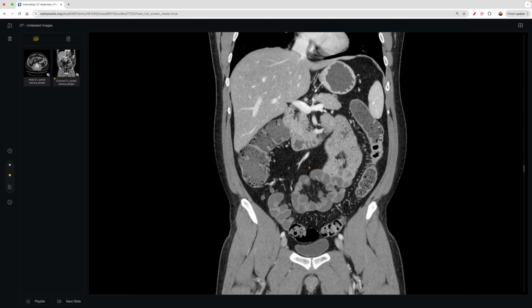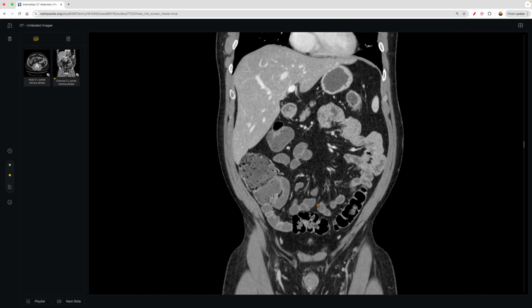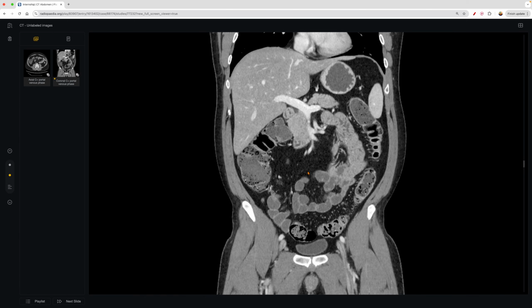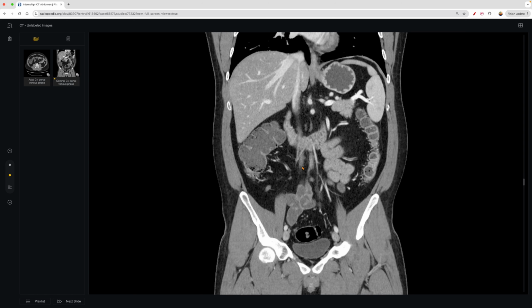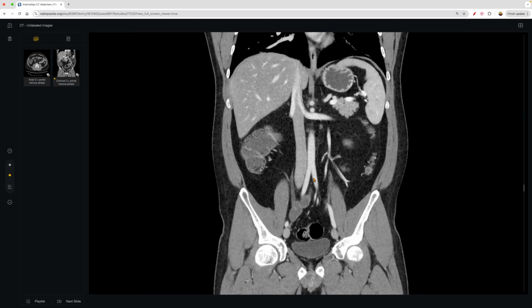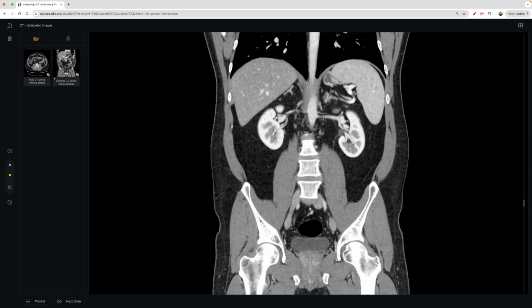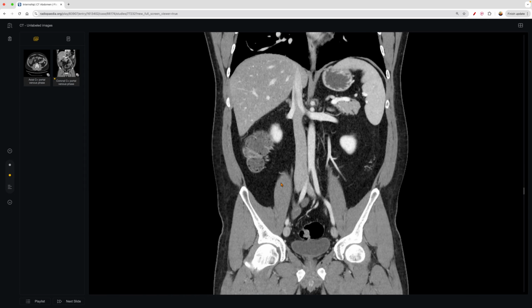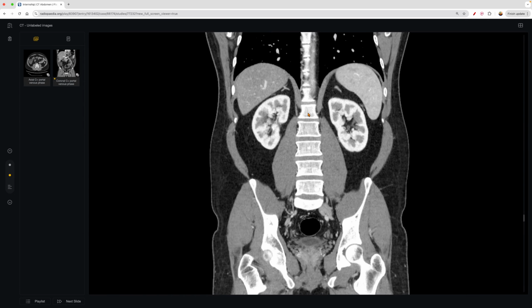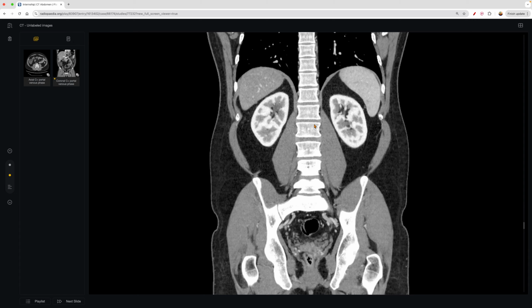And that is pretty much all there is in terms of the abdominal cavity. You can see here all this black is part of the mesentery, which is important because it's the fatty tissue within the abdominal cavity that allows us to appreciate inflammation in patients. And we'll see that in just a second. And then aside from that, we have the patient's bladder, and we have the psoas muscles coming here, and then of course the vertebral column as well.